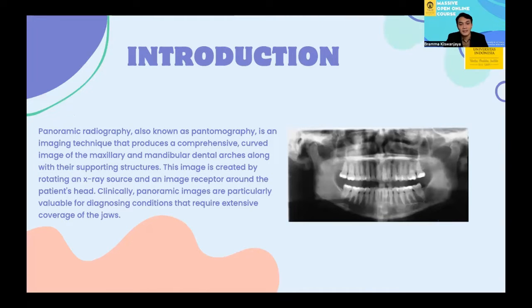To start, let's understand what panoramic radiography is. Panoramic radiography, also known as pantomography, is an imaging technique that produces a comprehensive curved image of the maxillary and mandibular dental arch along with their supporting structures. This image is created by rotating an X-ray source and an image receptor around the patient's head. Clinically, panoramic images are particularly valuable for diagnosing conditions that require extensive coverage of the jaws.